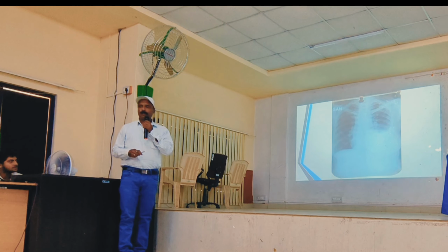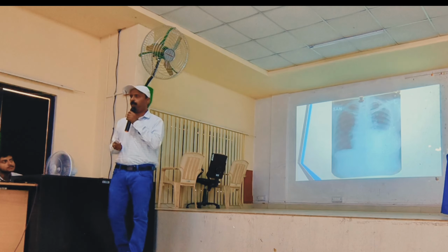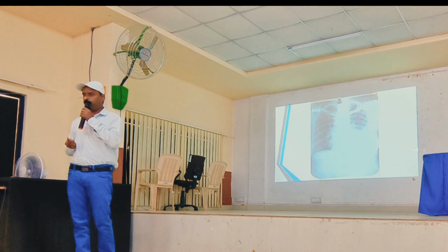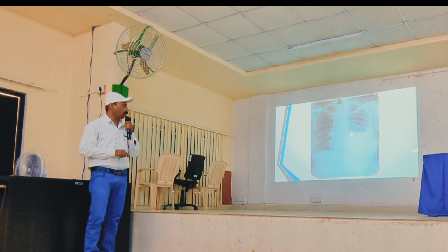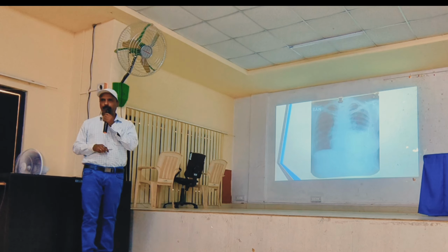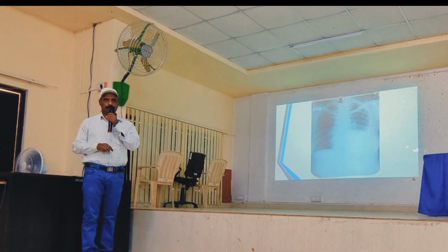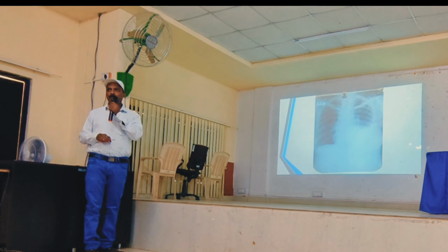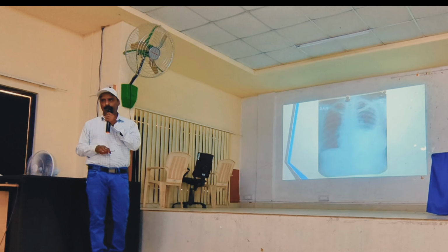So this is the one which is when we go for the applied anatomy, we have taught you what is a pleura, covering of the lung, pleural effusion. I have shown you the normal all. Here the white shadow which is filled with the fluid which is giving the pleural effusion we call. So don't think or comment that is a cardiomegaly here.